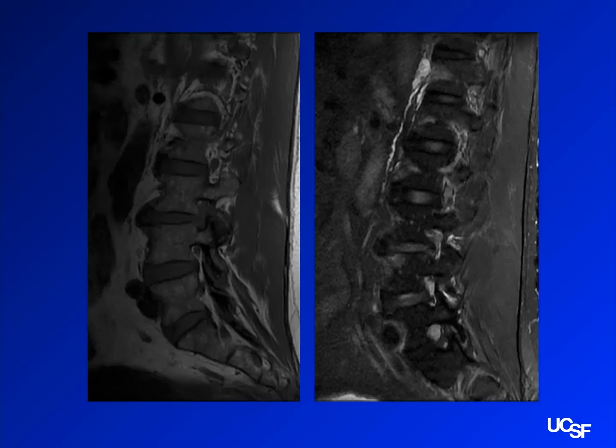I think again in that area, there's narrowing. Yeah, so here's as clean as the other one. This is the level above, right? So this is a nice looking neural foramen and has a lot of fat around it. Here's your nerve root. This nerve root is sitting pretty. It's very happy. Same thing at the level below. You got a nice keyhole of fat, nerve root right in the middle.